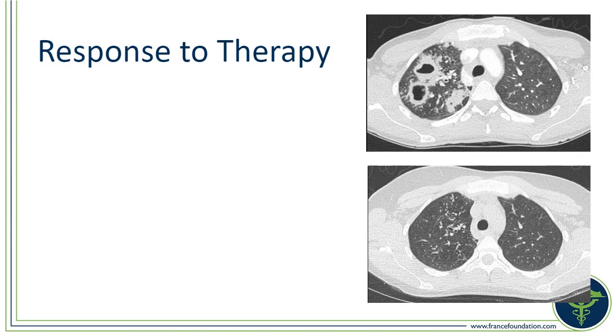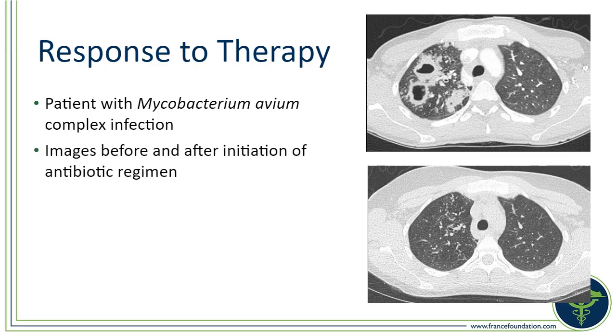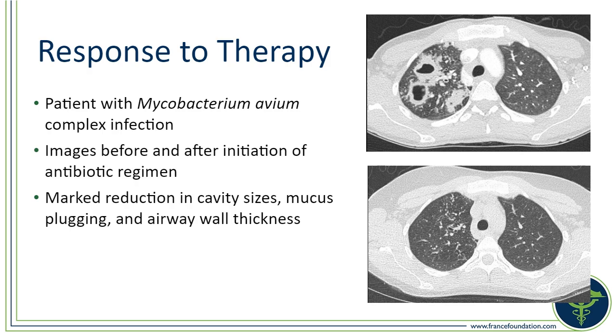Another example of a patient's response to therapy, patient with mycobacterium infection. Images are obtained after initiation of antibiotic regimen, and there's a marked reduction in the size of the cavities with near complete resolution of the mucus plugging and airway thickening.